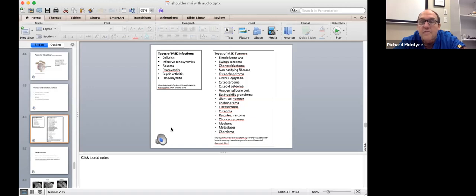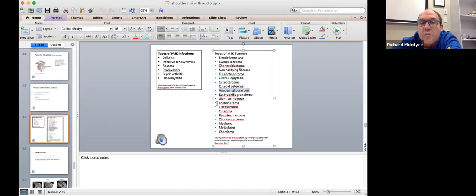They commonly have different imaging characteristics before and after contrast and on the different weightings, which is why we want to differentiate, for example, a bone cyst from a fibrosarcoma. So we do 5 different scans, or 7 different scans plus contrast, to show that the tumour that we're looking at is that and not that. Okay.